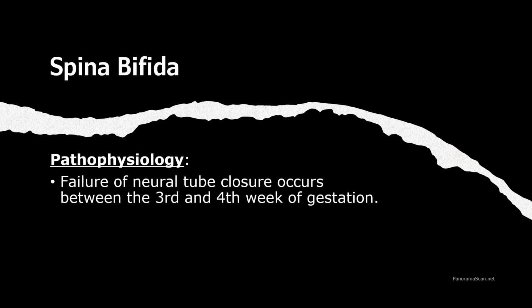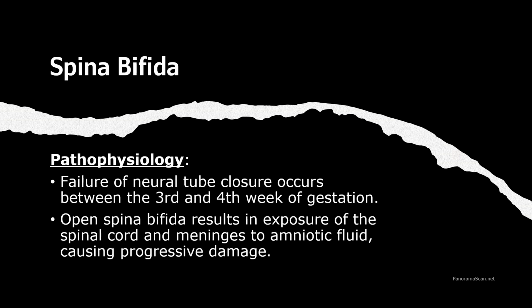In the case of open spina bifida, the spinal cord and meninges are exposed to the amniotic fluid, which can lead to progressive damage.